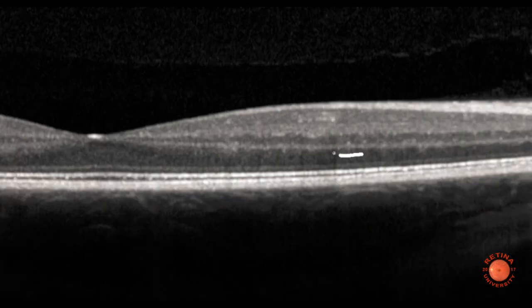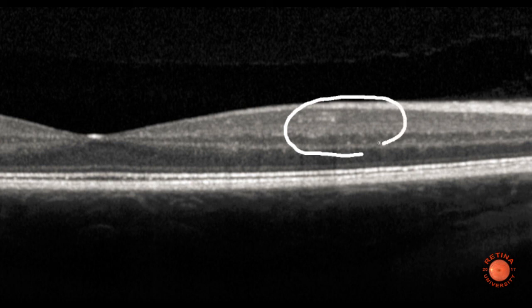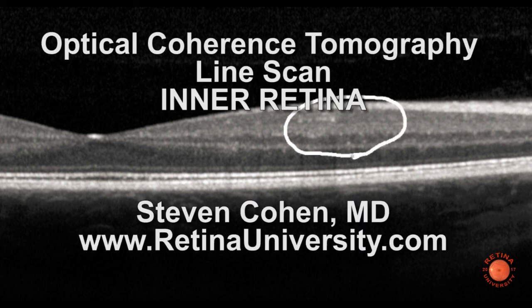This is the course on just the inner retina. We'll be covering other aspects of the retina in other parts of the course, and also we're treating the fovea as a separate entity.